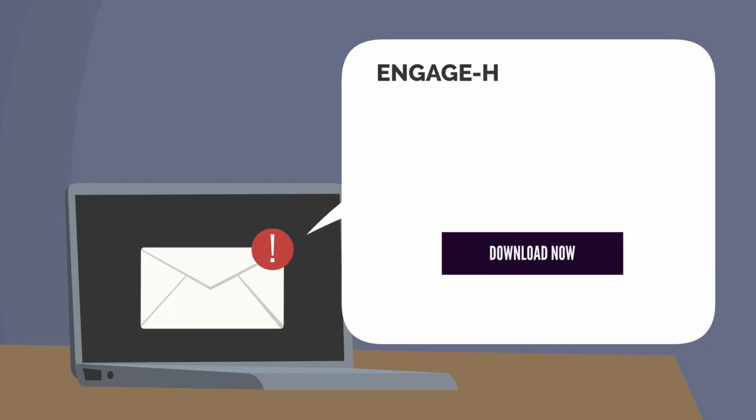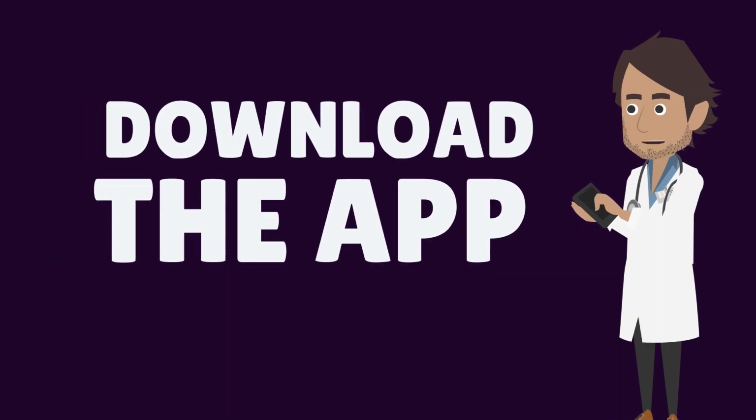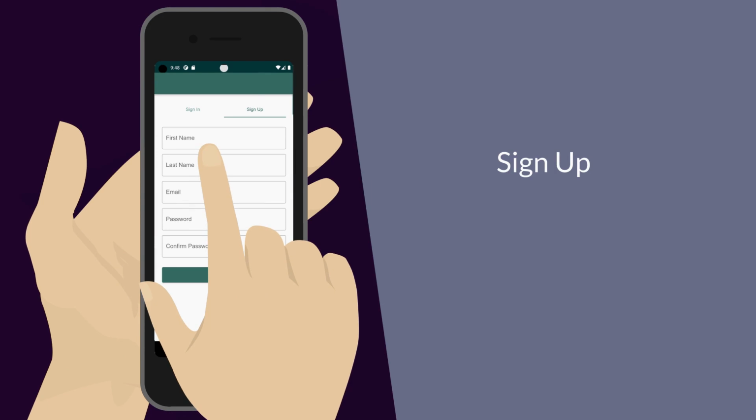To use the app, you will receive an email invitation to join a study led by .hf Collaborative Network. The email will also include a link for you to download the app. Depending on the type of smartphone you have, you can download the app from either the Apple App Store or the Google Play Store. After you have installed the app on your phone, you can sign up using the same email address given in the invitation. Just enter your first and last name, email, and make a special password.